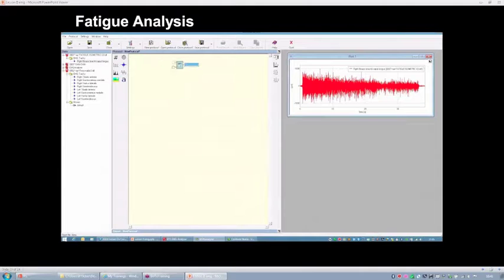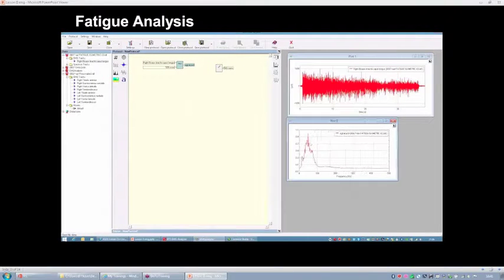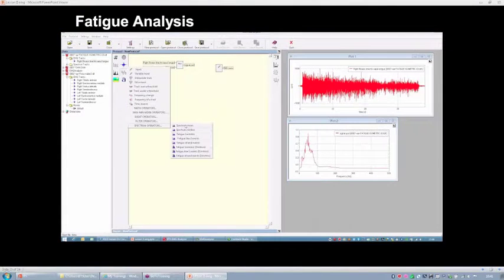So now I want to start by computing the power density spectrum of the signal, and I want to show you the shape. This is the duration of the time window. And this is the spectrum, and as you can see, it is shifted to the left with respect to a typical spectrum, if you remember.